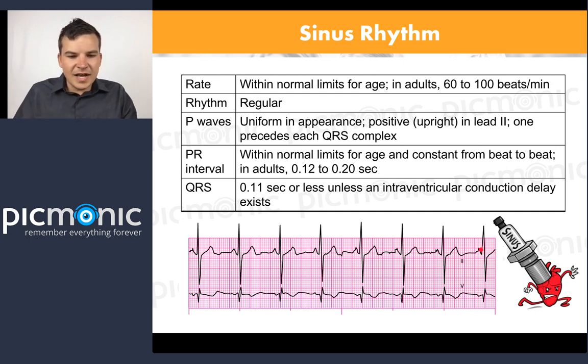Literally, just even glancing at it, is there more than 3 boxes in between that QRS? Not a chance. I don't even need to look at all of them and tell you all the way across. Absolutely not. So when you condition yourself, you quickly get the basics, and we're still on basic stuff. Then when we start doing these faster, we're going to go faster and faster, right? That's the idea.